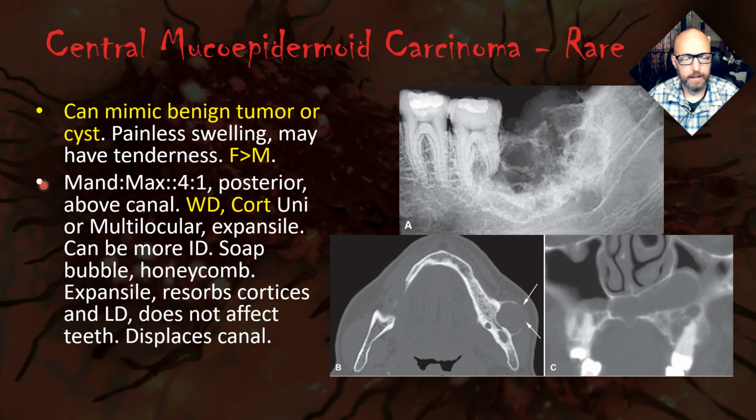You see a lesion like this, you suspect, probably under differential for these ones, just based on what we see here, it's going to be your ameloblastoma, your OKC, and you might not be thinking malignancy. And then that's why biopsy is always important. Biopsy could come back and point out it's one of these rare malignancies that's simulating a benign thing. So see the well-defined corticated borders.